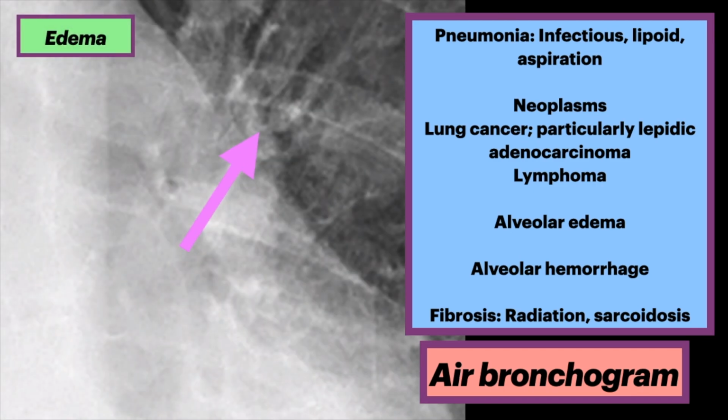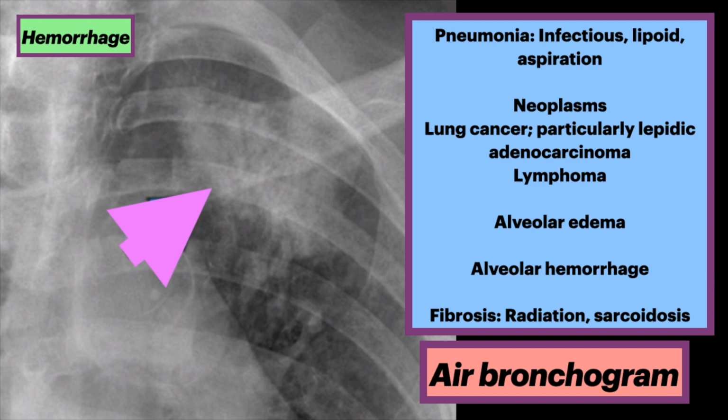This X-ray shows predominantly central pulmonary consolidation with intrinsic air bronchogram. This just happened to be a bat wing pattern of alveolar pulmonary edema. Lastly, this X-ray of an adult female after left upper lobe nodule biopsy shows a dense consolidation with air bronchograms. This was consistent with pulmonary hemorrhage, frequently seen after biopsies.